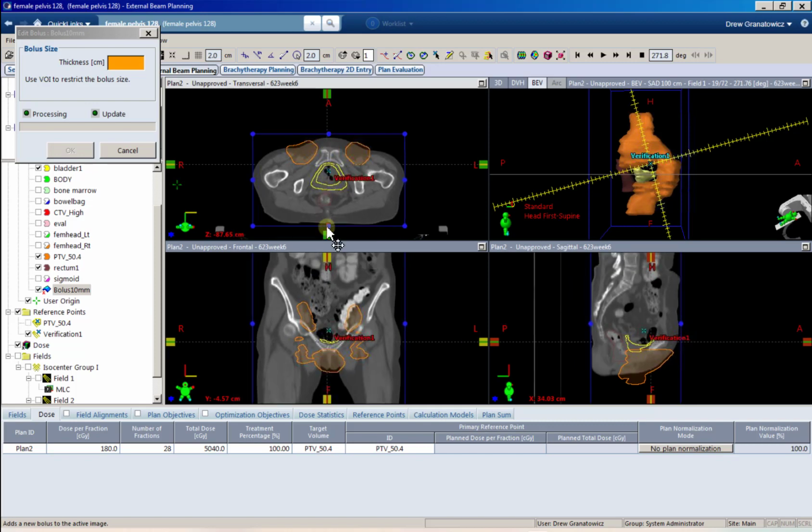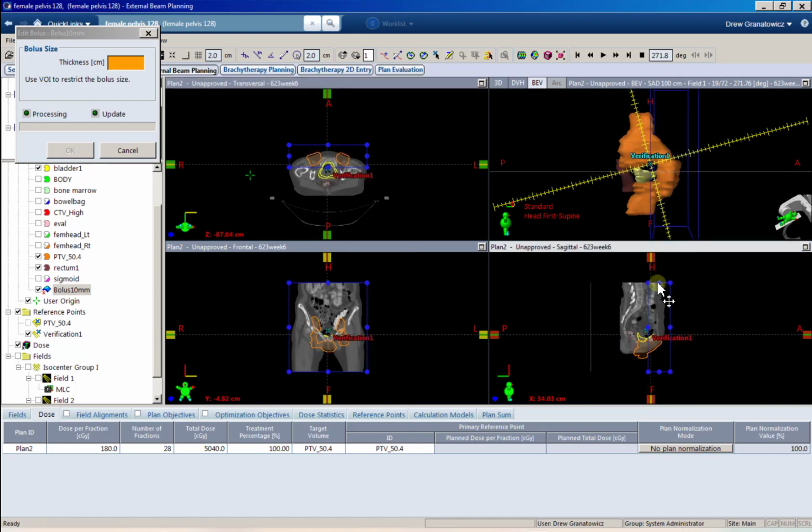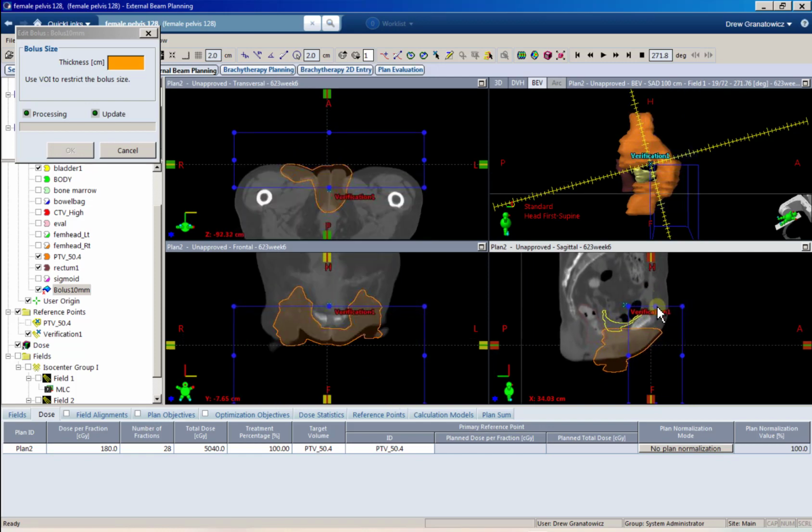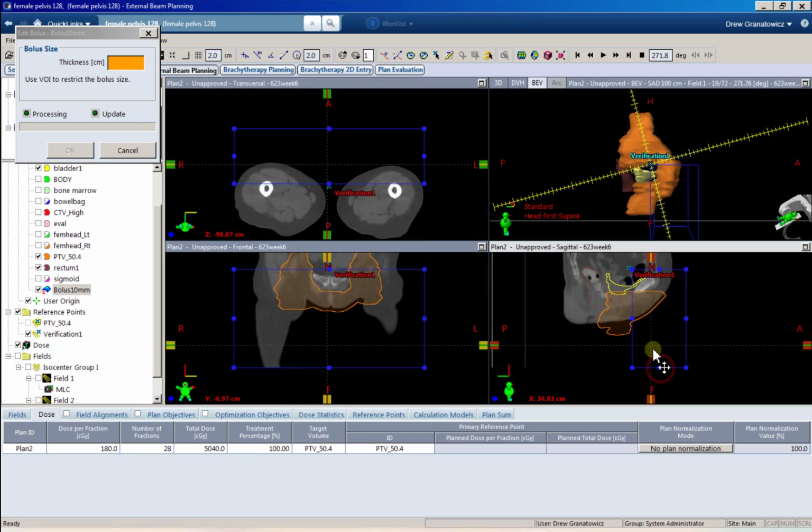And when you're making a bolus, you use this blue box, right? I know you guys have all made a bolus before, but maybe not for a VMAT plan. So the only difference between making a bolus for VMAT and IMRT versus 3D is usually a lot of times for 3D you're going to just cover your whole field with that bolus. For IMRT or VMAT, I mean, we're treating all the way around the patient with full arcs, right?